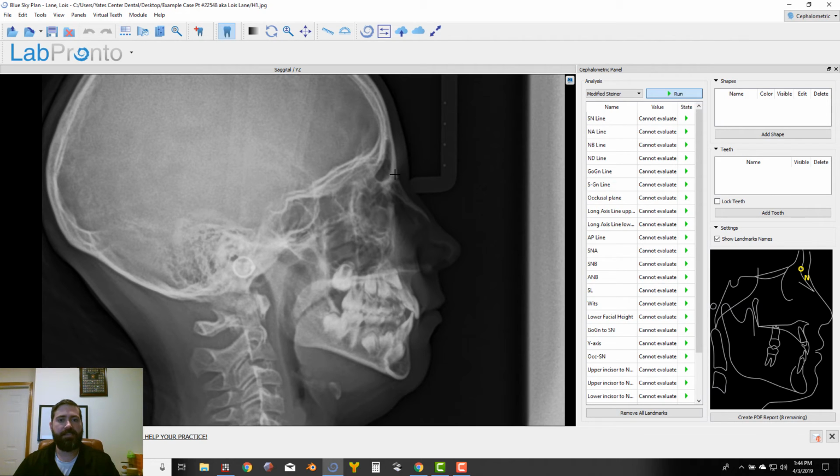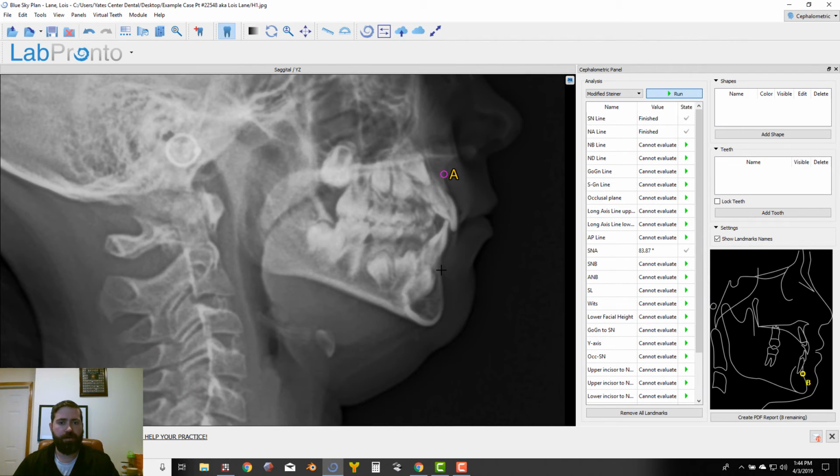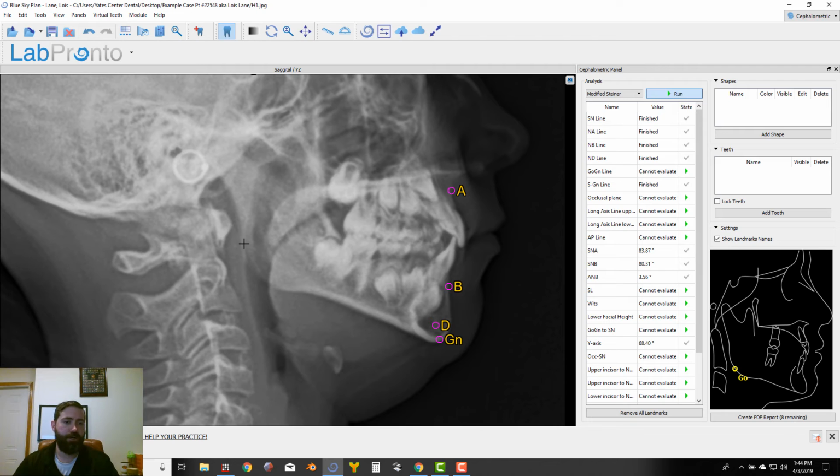So here we're looking at the Nasion, about there, Sella, about here, A point, which is the innermost point here, B point, about right there, D, middle of the symphysis. We're looking at GN. Looking at GO. Gonion, if you're marking this, just a little side note, if the patient has had their head tilted, or if they just have facial asymmetry, you will see ghosting, double images of the mandible here. Just hit kind of smack dab in the middle. Here it's a nice crisp image, so we're going to hit right at the mark there.